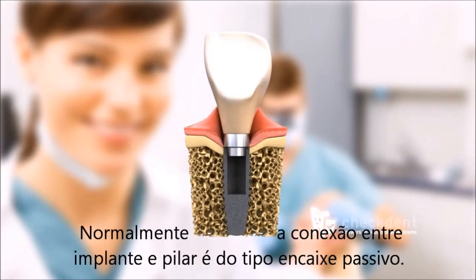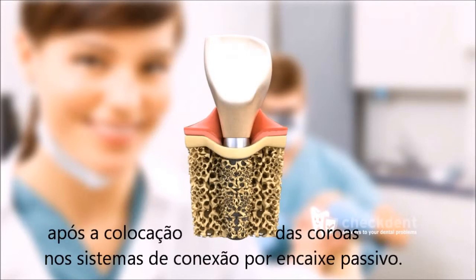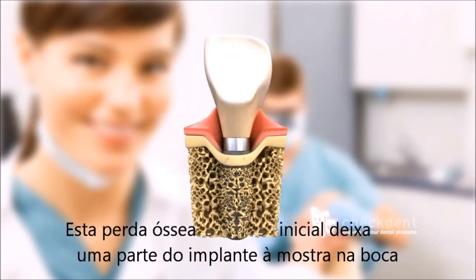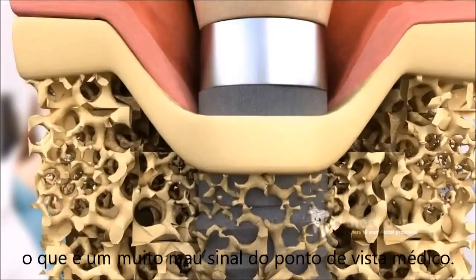Normally, the implant abutment attachment is a plug-in connection. For some unknown reason, immediate bone resorption after prosthesis insertion has been observed for a long time with abutment plug-in connections. The initial bone loss leads to upper parts of the implant protruding out of the gums, which is a very bad sign from a medical perspective.